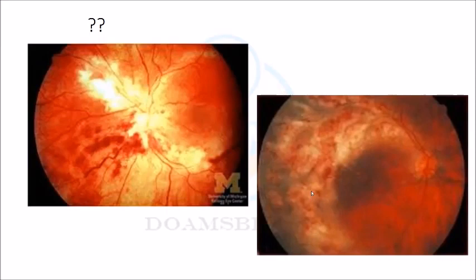It may be second. Whatever the etiology, maybe toxoplasma, maybe cytomegalovirus, maybe candida and others. But it is told in the textbook, the appearance of viral retinitis is called pizza pie appearance, cottage cheese appearance. Many terminologies are there. So if it is mozzarella pizza or pizza pie appearance, what could be the diagnosis etiologically? Can anybody say? Cytomegalovirus. And you can find that in the book. It is told as CMV retinitis.